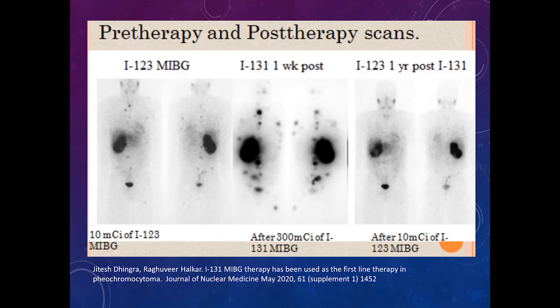And then we treated this patient with 300 millicuries of I-131 labeled MIBG and took an image like we do after iodine treatments in thyroid cancer. It's the same I-131, so we can take a picture after treatment, and we see that there is very good uptake of radiotracer in the main tumor and in the metastases.